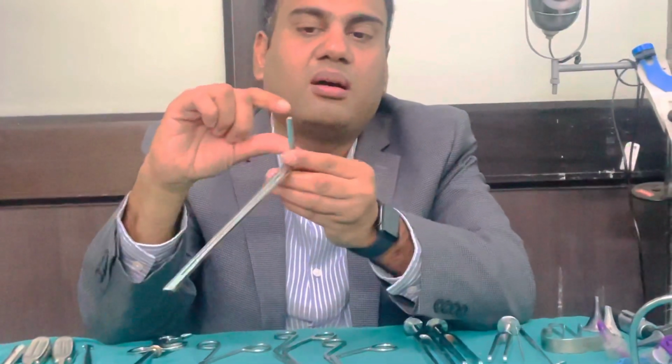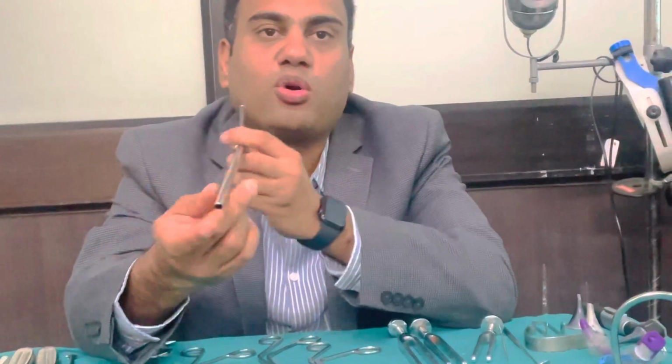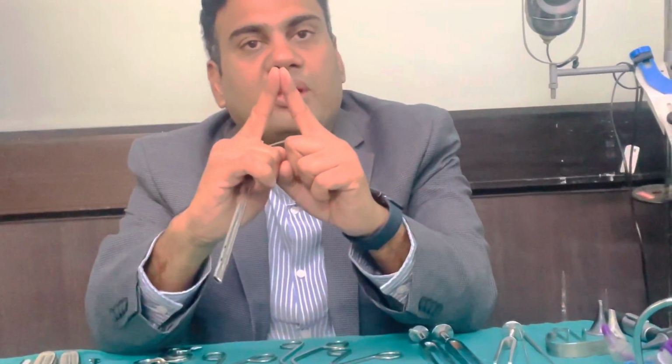Now the other projection that you can see is to guide how the beveled end of the bronchoscope is oriented inside. So once the scope goes inside, how will you know whether your scope is in transverse or in vertical position? So this particular end will guide you how the beveling of the proximal end of the bronchoscope is. Now there is one very important concept that you should understand, that this bronchoscope is flattened from lateral sides because it has to negotiate the vocal cords which are oriented vertically when the patient is lying down. So this bronchoscope has to negotiate those vocal cords.